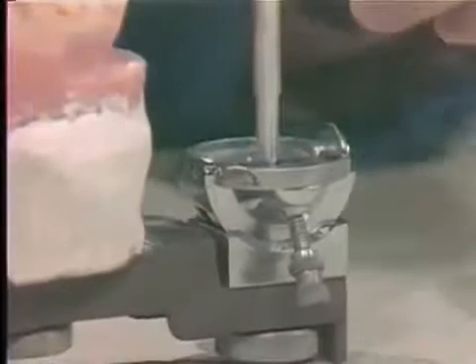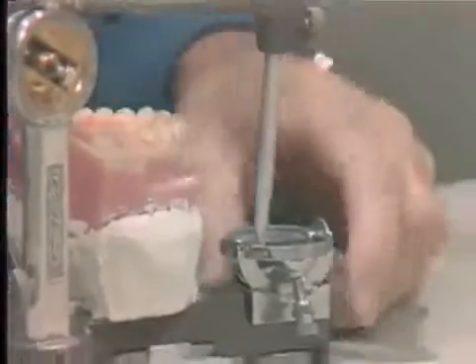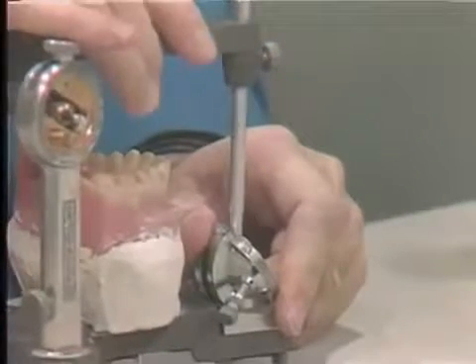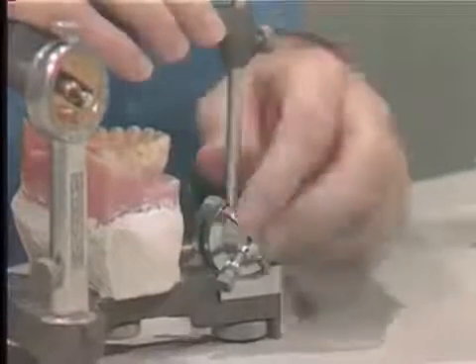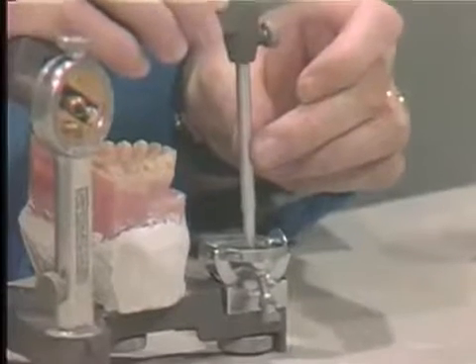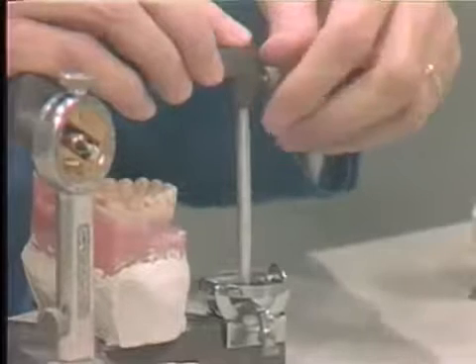Okay, now if you miss it the other way and you forget to do that, your pin will go in this direction if you forget to drop the pin, and then when you get ready to set your incisal table, you can see that you will not have any working room. You've locked yourself in. So it's necessary, when you take your centric wax bites, to estimate the thickness of the wax and drop the pin that thickness, so that when you do remove the bite and the teeth come back in contact, your pin will still be centered.